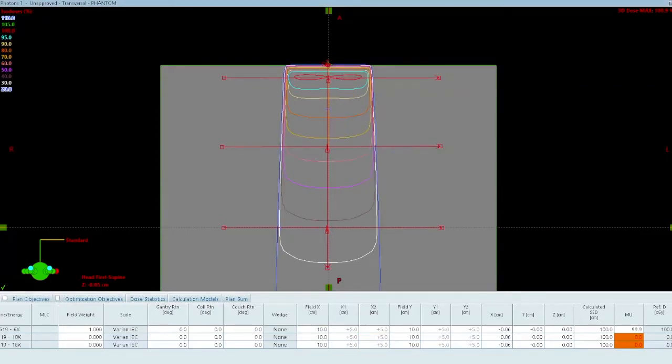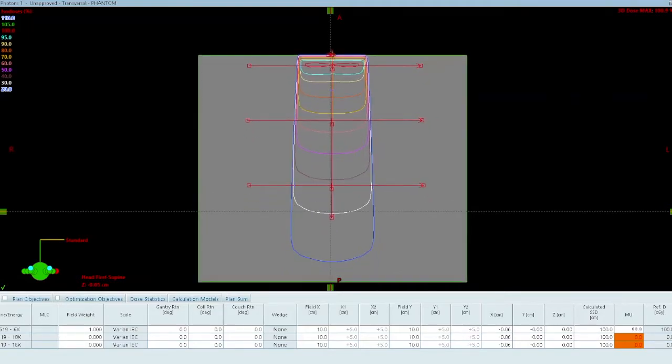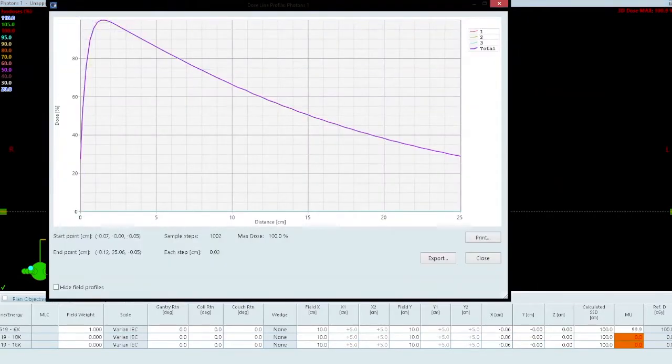Okay, so now you can see I've added these discrete levels for isodose curves. Some centers will use isodose lines to evaluate their plans, some use a color wash to evaluate their plans. But as I work deep down the central axis, the percent depth dose curve is describing how the dose changes with depth.